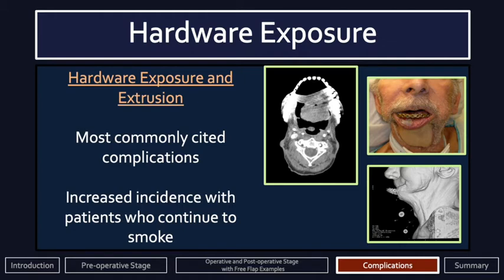The patient was lost to follow-up and rolled into clinic 4 years later with their recon bar completely uncovered, and they were still smoking. Here we can see the pectoralis major flap that was used to close the anterior neck defect, and you can see a portion of the stomal collar.